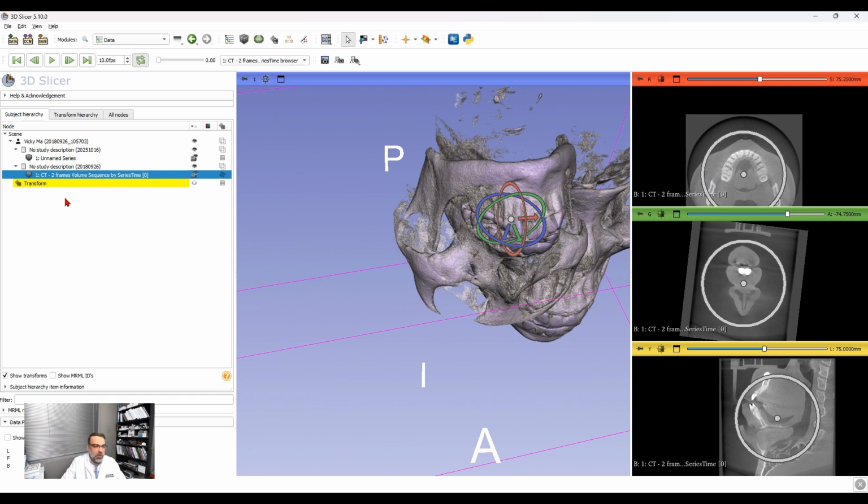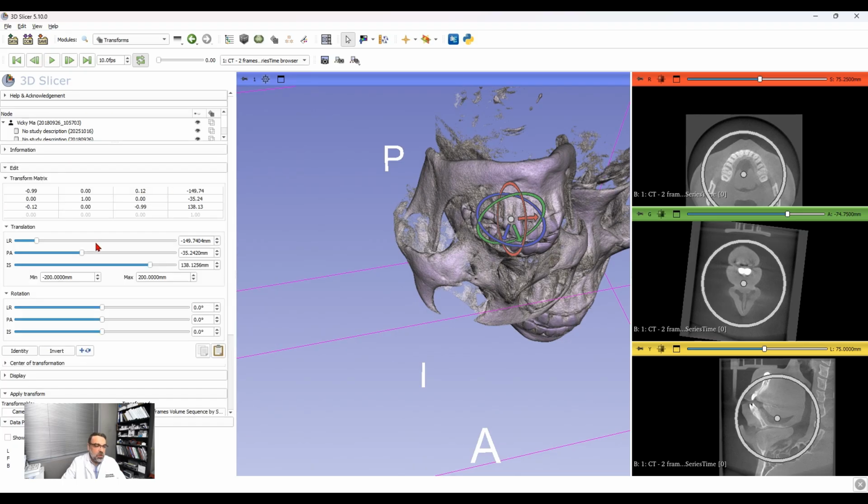But what I want you to see here, if I go here to transform and click properties, you will see on this matrix what we have done. You see, so I want to have these numbers from the before and after, and then I will use that amount of transform to do it to the whole skull before and after.